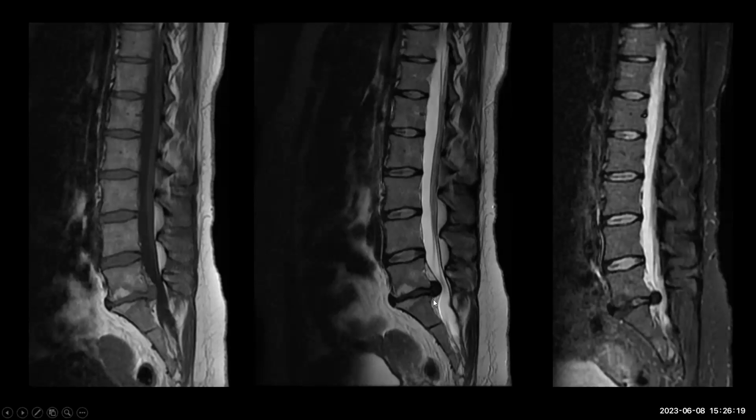So you have a case in which there is a bit of a debate. This could actually be called a disc extrusion, because many people, when they're quantifying discs, just look at the axial planes. What about the sagittal plane? In the sagittal plane, if the base is narrower than the disc itself, the same rules apply. On this image, you can see that the base is narrower than the vertical height. So in ideal circumstances, this should be called a disc extrusion. I've put it here to highlight that many people just see the axial images and call it a protrusion, whereas this is actually an extrusion, because on the sagittal images, the base is narrower than the vertical height.